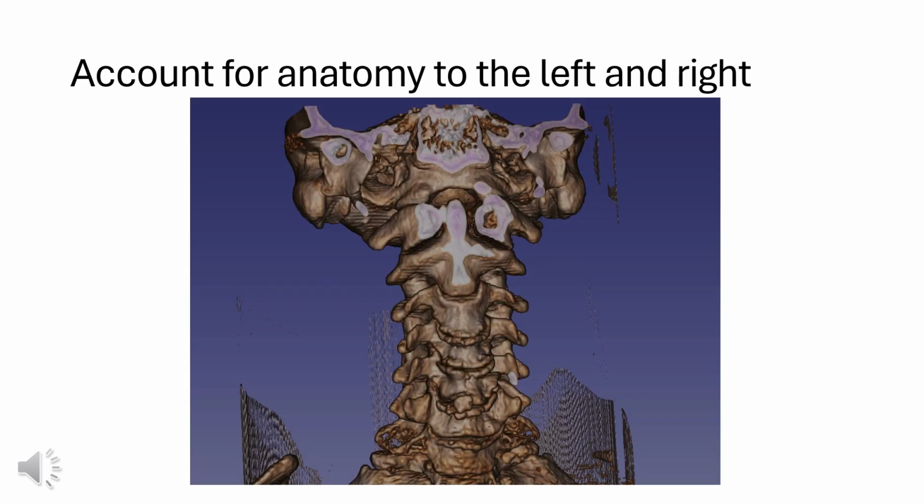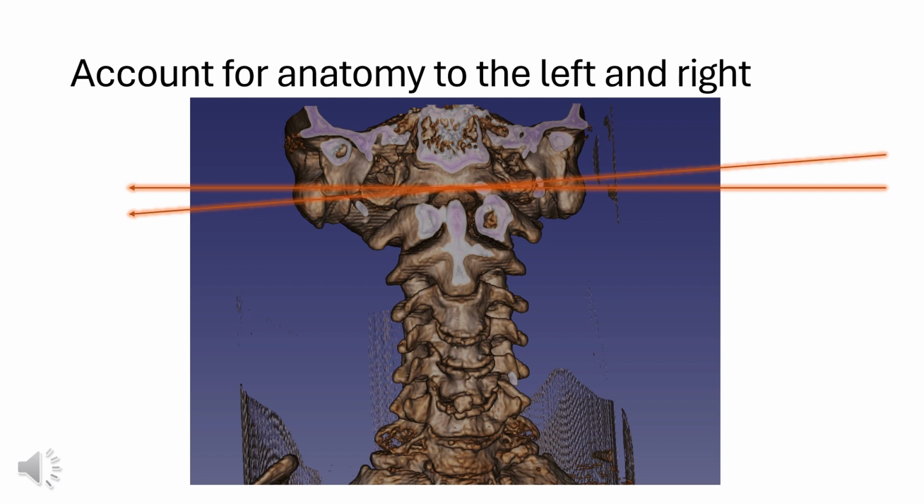Here is a three-dimensional view of the region of the basion, with all the anatomy in front of the basion removed. This also helps to appreciate the complex anatomy to the left and right of the basion that will appear in the X-ray, and the appearance will change depending on the path of the X-ray through the anatomy.